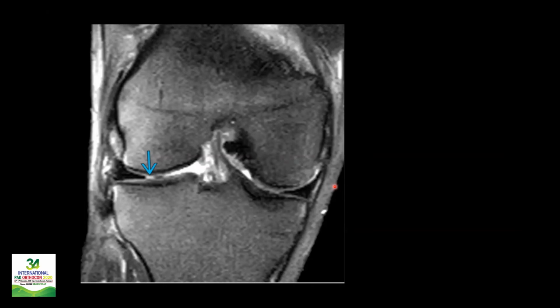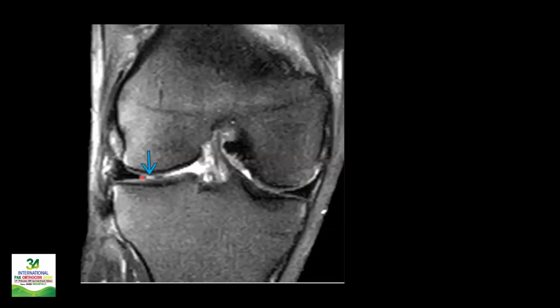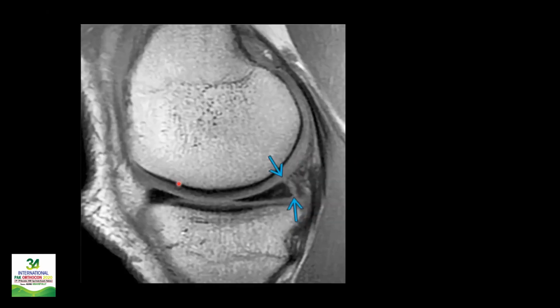Just have an idea what you think this tear is. Now you can appreciate we have seen that in the outer half, if you see a defect, it's more likely going to be a vertical tear, whereas when you come to the inner side of the meniscus, these tears are going to be radial tears. If you see this meniscus, it tapers in a very smooth fashion. You can even appreciate the tip in this region. Whereas on the lateral side, there is an abrupt tapering of the free edge, and this is the radial tear in this region. So this is the next case.